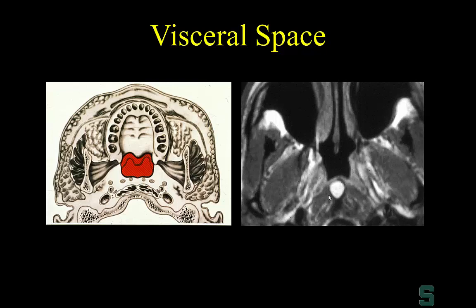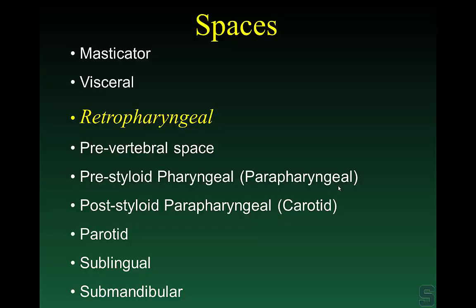So why does this make a difference? It makes a difference because we can see that this Tornwaldt cyst is anteriorly displacing the overlying mucosa. So this is a submucosal mass that's causing some mass effect. Our ENT surgeons may see this submucosal mass, but they may not be sure what the exact etiology is. So we can say that there's a submucosal mass, it's cystic, and we can confirm the diagnosis that this is not ominous, rather that this is just a Tornwaldt cyst.